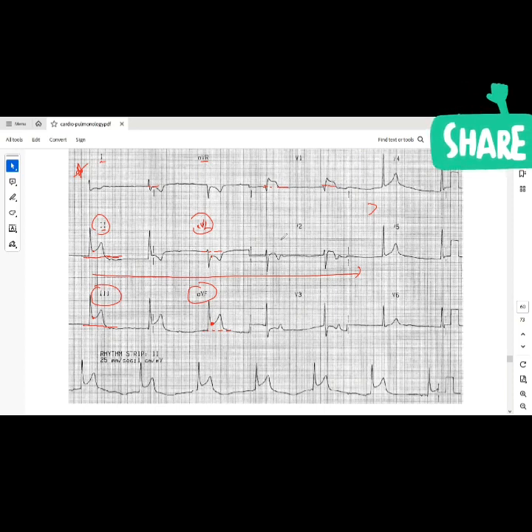But if you see ischemic change in lead 1, ischemic change in lead 3, and another ischemic change in lead V1, are they looking at the same surface of the heart? They are not. What are the chances that somebody will have infarction of all their coronary arteries at the same time, all the branches occluded at the same time? Very low, right? And if that happens, will that person present to you in the hospital? No. They won't make it to the hospital.